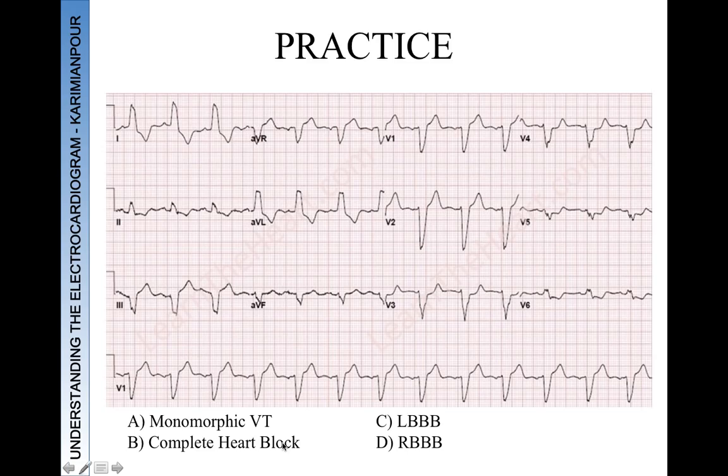So let's do a practice question. We'll pause the video here and take a few seconds. Okay, so what does this look like to you all? Again, using limb lead 2, you look across and you see if there is any P wave activity at the baseline. This is obviously widened.